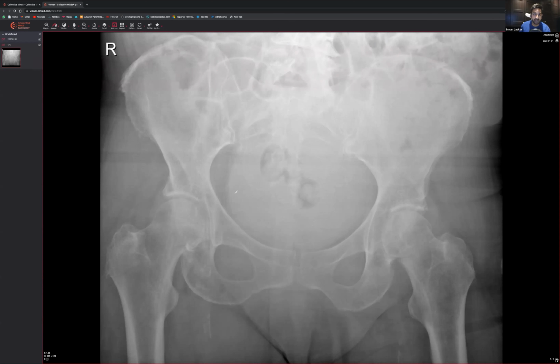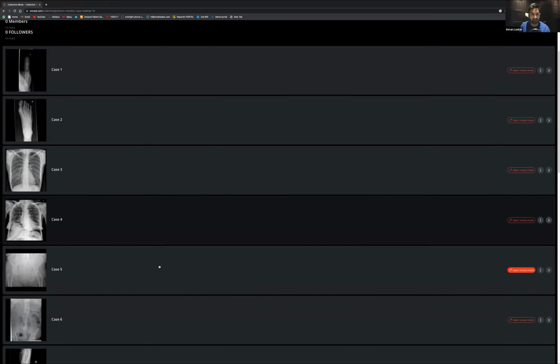One thing I would say though, for the more subtle eyes, you can see that there is a line over here, which is the joint capsule. But on this side, can you see how it looks a little bit more bowed out, a little bit more bulbous around that area? That could tell you that yes, there is a fracture, and there's also a bit of a joint effusion as a result. So it's very good to look for symmetry, but sometimes you've got to go with what's common, right? It's very unusual to have a fracture within this area. It's very common to have osteoarthritis in the area. So if anything, I would suspect there's osteoarthritis located within the superolateral margin of that hip. But that's just based on my experience and what I've seen over the years.